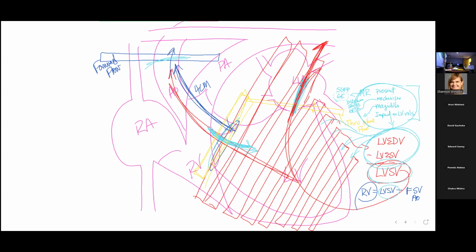Well, here we can take our... remember now we've got a high velocity jet going this way. We've got to remember, what are we going to set our velocity encoding to be? What velocity range, plus or minus? Probably 6 meters per second or something like that. And you can dial this in with the technologist, and then you can measure the peak velocity across that aortic valve.